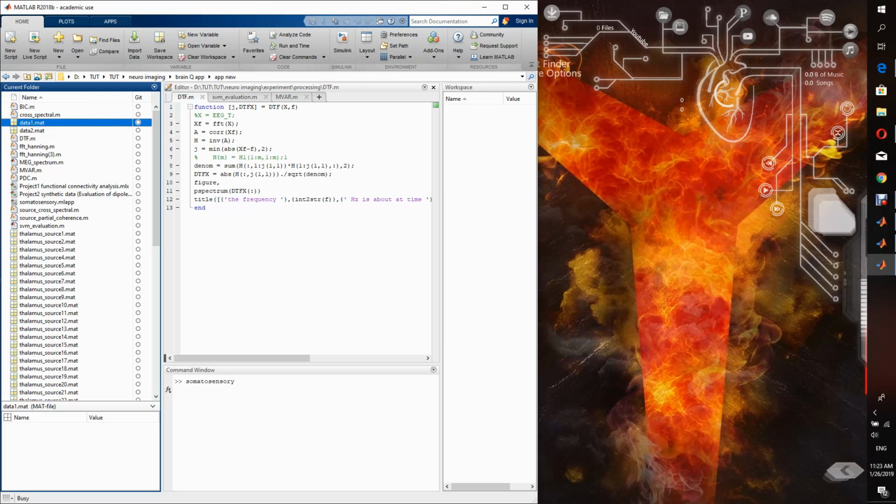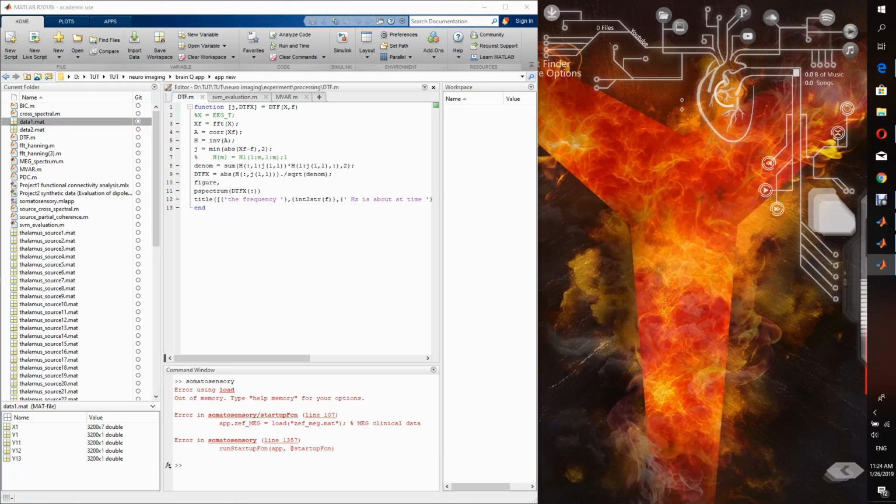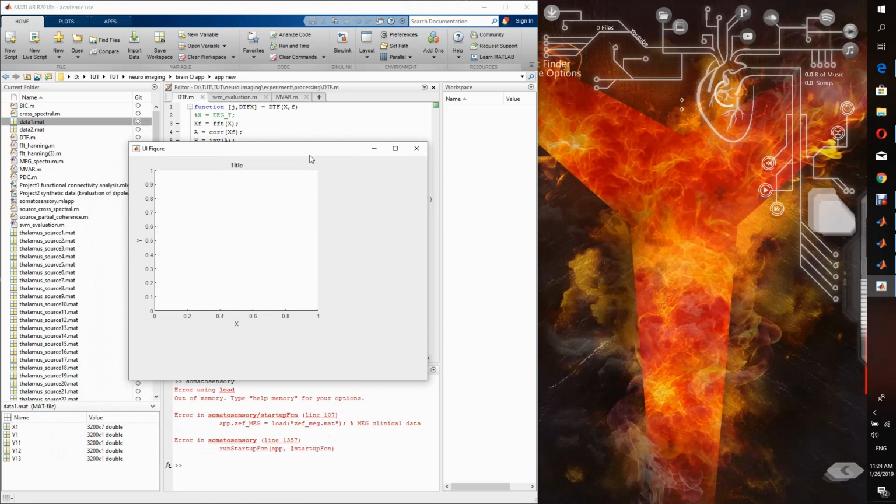The first one is the result with the MAP inverse method, and data 2 is only related to the central estimator, not the maximum a posteriori estimator. And because I don't have the power of the GPU included, it's really slow. Later, I guess the GPU power will also be added to my application.